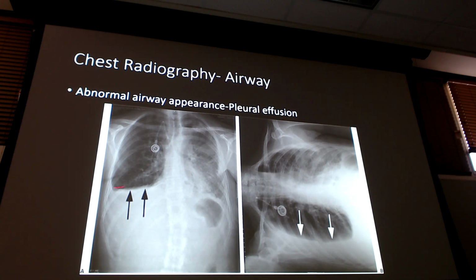So here's what that looks like. This is a severe one. The pleural space keeps filling with fluid, and we get these lovely air fluid lines. Fluid fills up and stops, like a glass of water. You just see it right there in that glass of water.